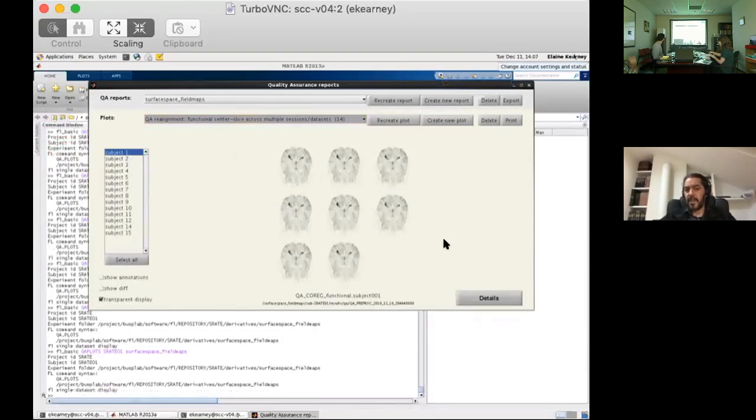This is just looking at the realignment, and it's showing you the first and the last scan image of each run. So you probably have 4 runs in this, and it's just showing you the first and last. The whole idea of this is making sure, visually, that they all look pretty much identical. If the realignment works correctly, then all of the gross subject movement should be corrected. So after this correction, one particular slice should be identical, or pretty much identical, independent of what time point it was acquired or during which run. That's what you see here. I don't see any obvious or even noticeable differences between those 8 images. So that looks fine, basically.